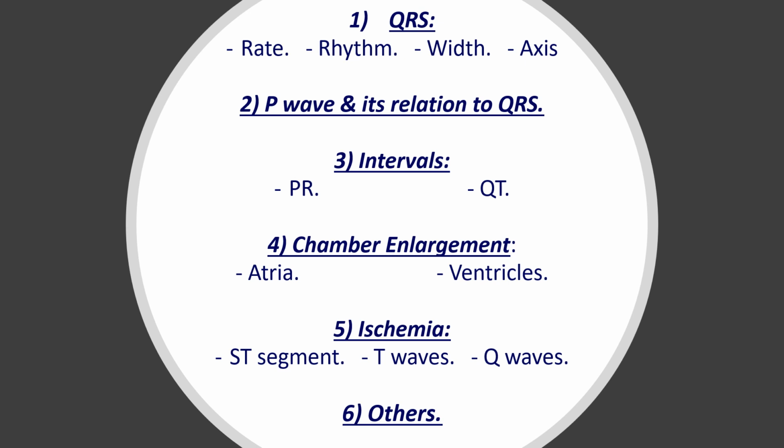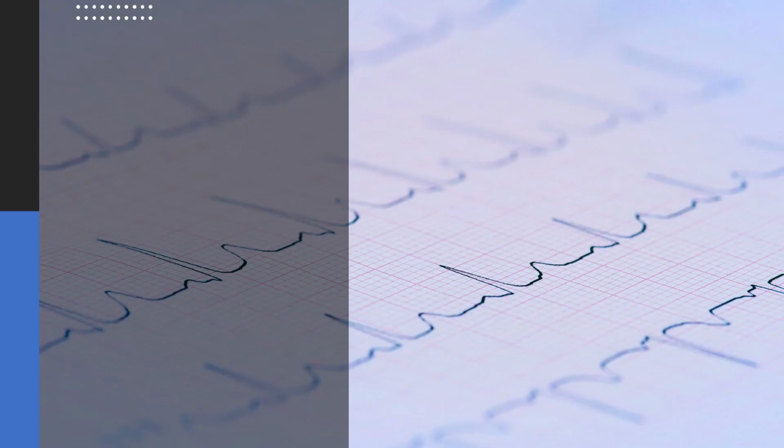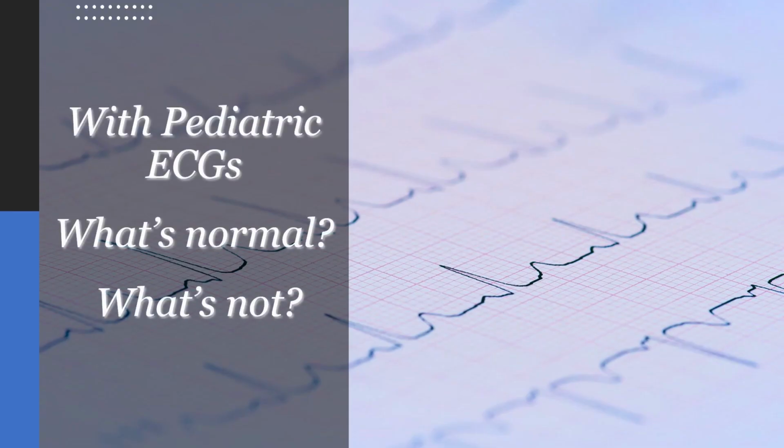So this is the approach that we've used before for adults, and this is the approach that we're going to use for pediatric ECG as well. It's exactly the same. All you need to be aware of is what's normal for kids and what's not.